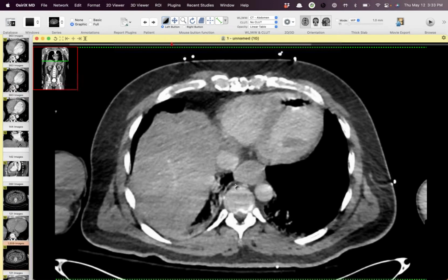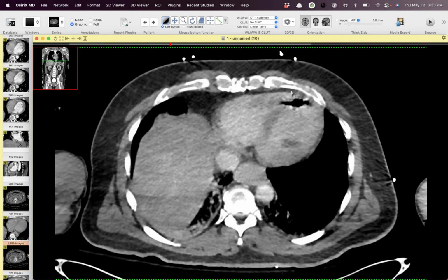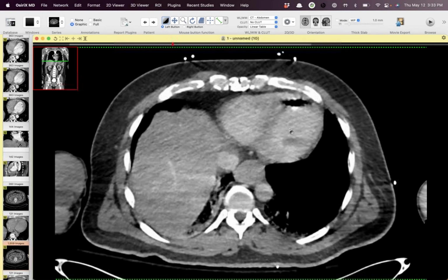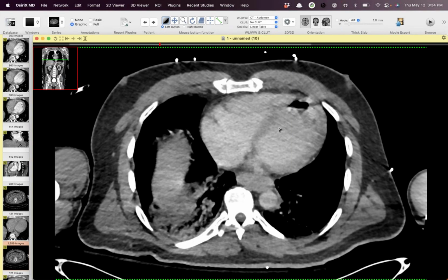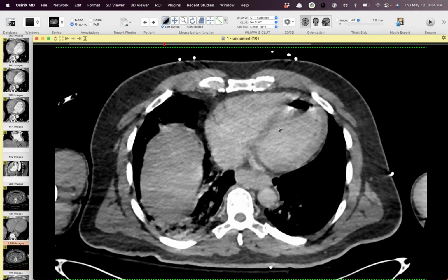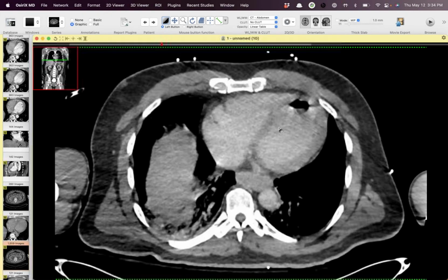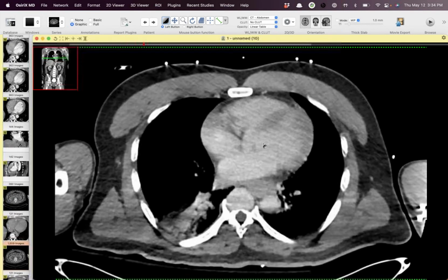And the surgeons always want to explain this as just because of the PFO or the atrial septal defect they create when they do the ablation. But I think everyone would agree that we've never seen air in the left side of the heart except in this situation. At least I haven't. Except for contrast injection on CT. No, I'm sorry, that's on the right side. What's that? Yeah, I take it back. And this patient actually had left. Right. Yeah, that patient had a little bit of air from the contrast right there.